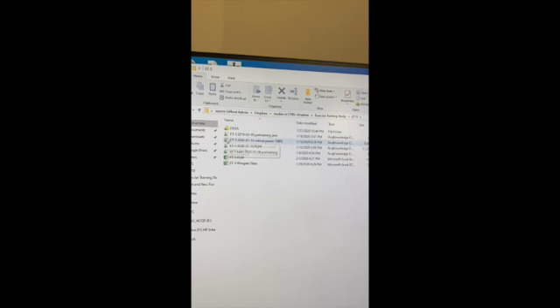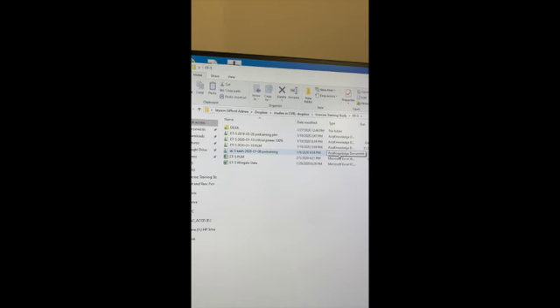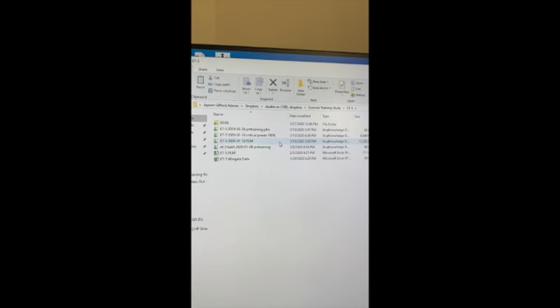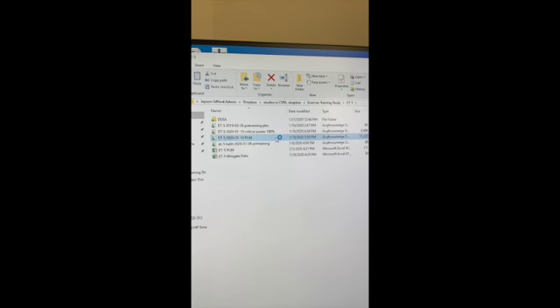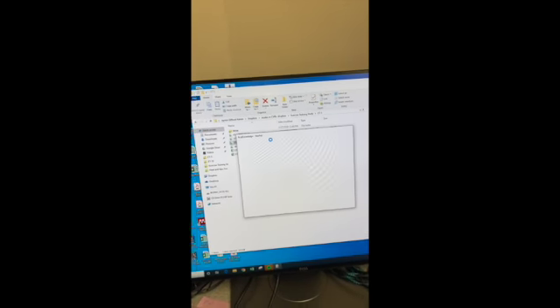on the little icon, which is slightly different, but also it will say acknowledge document. That's how you know it's from the CNAP, that's the BioPack data. So today we're going to do PLM, so we'll double click here on our PLM file and then wait for that to load.